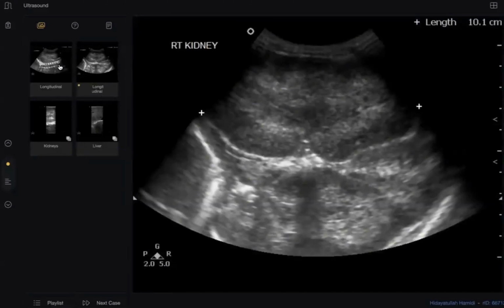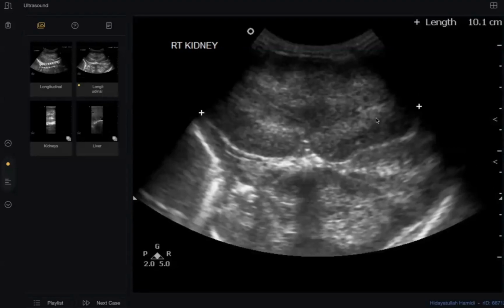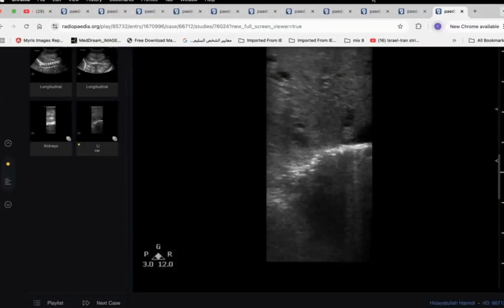Despite being polycystic, no cyst can be detected. Why? Because they are micro, very small cysts. It makes the kidney enlarged and echogenic. And in the liver, there is fibrosis. There is an opposite relation between the degrees: if the degree of polycystic disease here is high, the degree of fibrosis is less. They are opposite, but there is an association. This patient's condition is incompatible with life. This patient has oligohydramnios due to no liquor, meaning no urine, so no liquor.